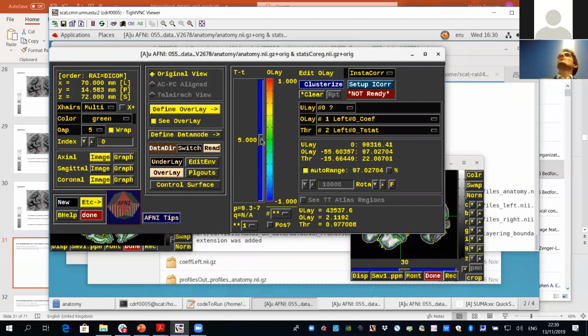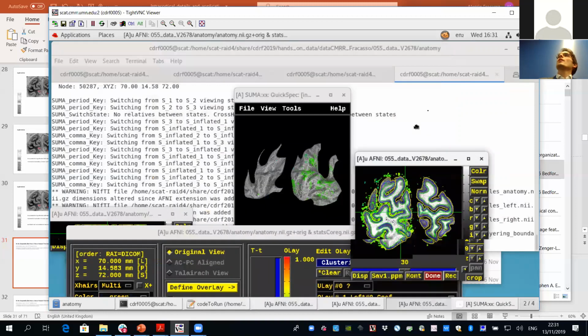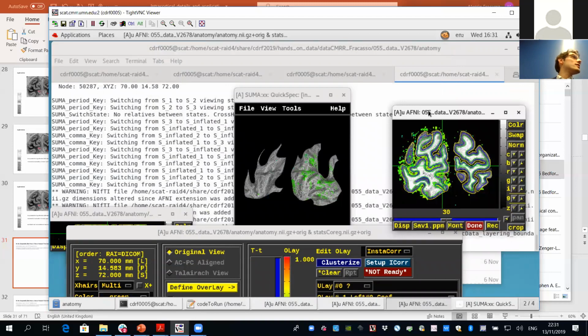Was this surface extracted from a whole brain acquisition or from a partial? This is from a partial volume. These were several acquisitions averaged together. And this is from a partial volume T1 weighted time. And the results of the segmentation, this is heavily manually edited, but if you run this through 3dSeg from AFNI, it's going to give a very good result. I have a little pipeline that deals with partial volumes as well. Yeah, it's from a partial volume.